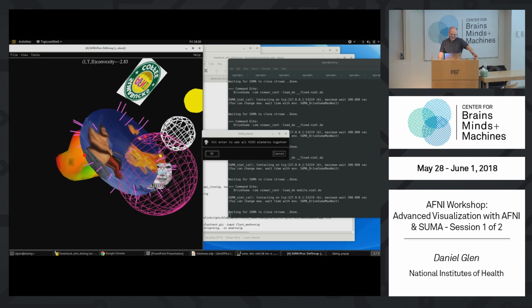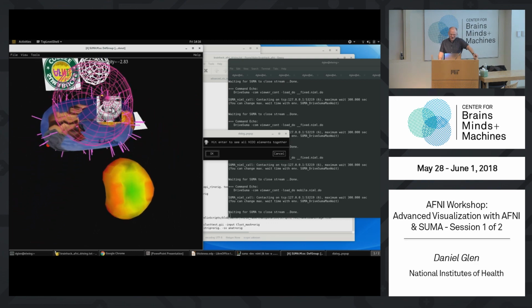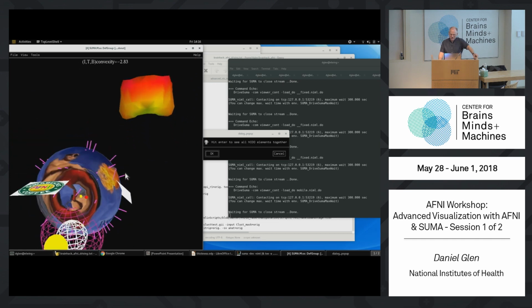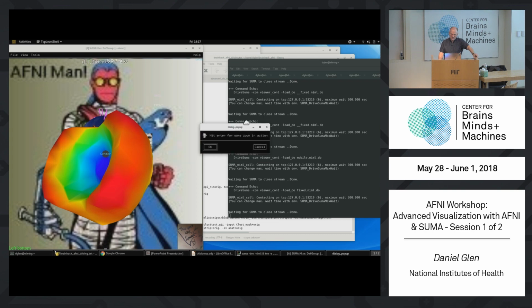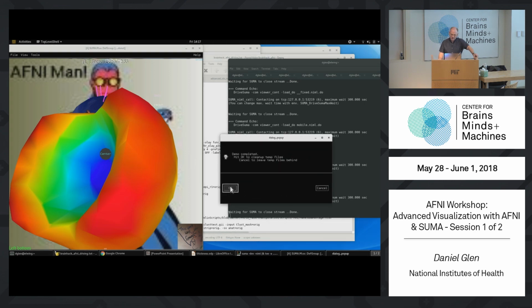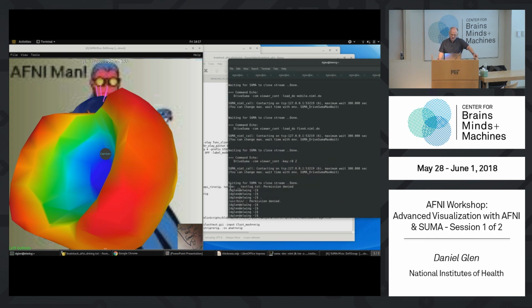That's right. Yeah. So here you can color your surface, your displayable objects, with an image too. Some text. You can have it do the keystrokes and zoom in. And I can see I have a window there. So, okay. And that's it for the displayable objects. So some extra kinds of things that you can put into a scene with surfaces.